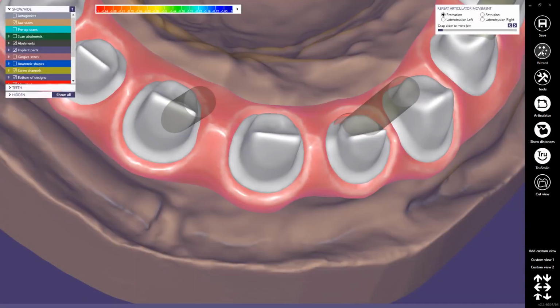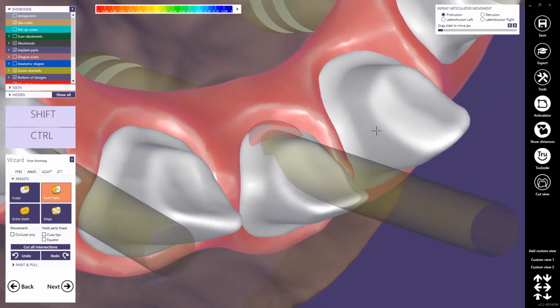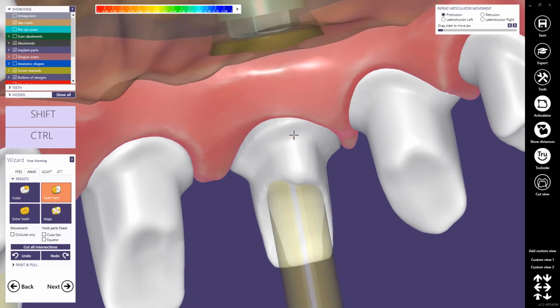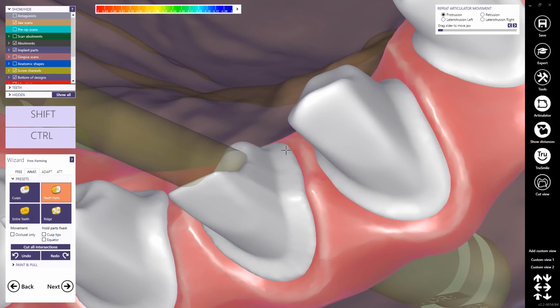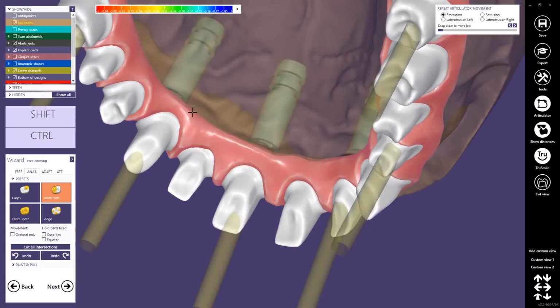And now we will go back to the wizard and do some freeforming on our thimbles. So first of all, I'd like to solve this issue here. No problem. Okay. Some material like this. Then it's okay, to cover the minimum thickness of the implant geometry.